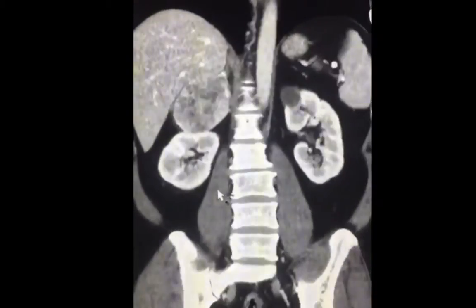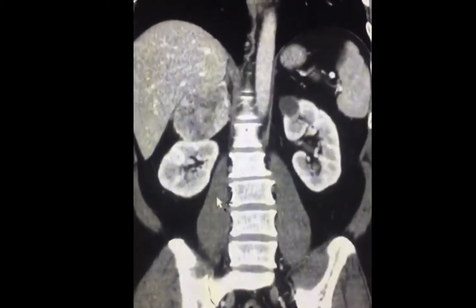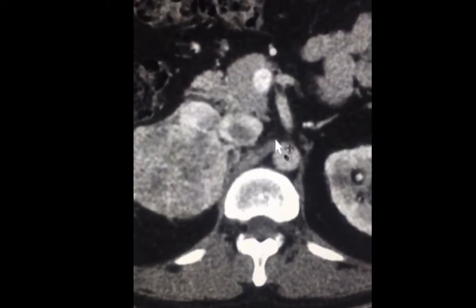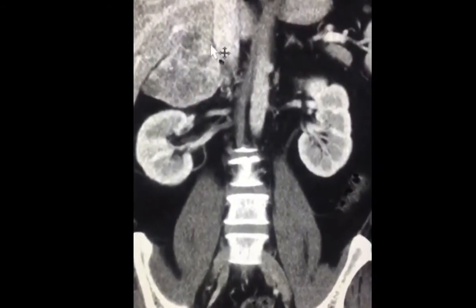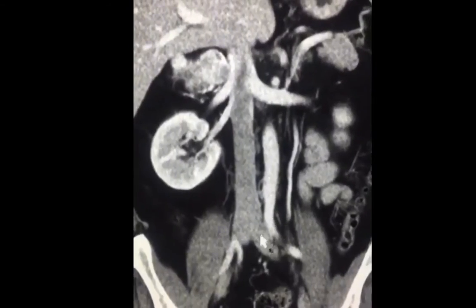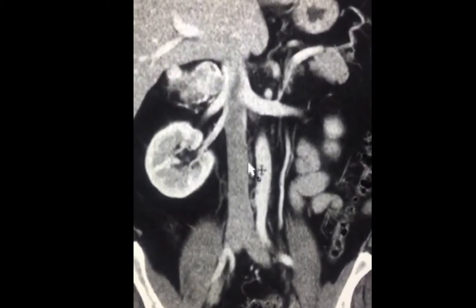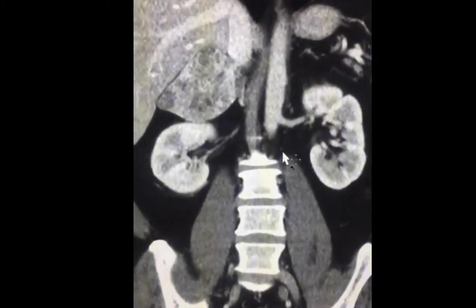Both adrenal and renal neoplasms may invade into the adjacent IVC, either directly or via a tumoral thrombus. Remember how we questioned a filling defect on the portovenous phase? The coronal image shows it all. The adrenal neoplasm is well separated from the adjacent IVC. And what was questioned for being a thrombus turns out to be non-opacified blood returning from the IVC and mixing with opacified blood. This is a neat case with several teaching points.